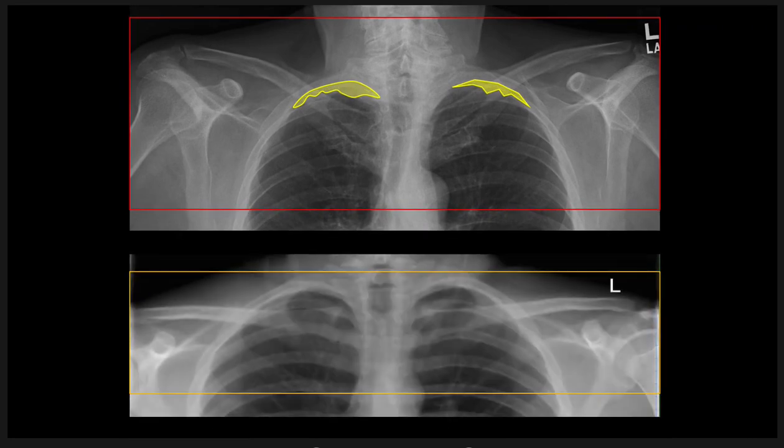Notice in the normal situation how we've got a really sharp appearance there at the apex. I can sort of look back and forth and see, yeah, there's just a little bit of irregularity there. This guy would be okay without, depending on your clinical suspicion, of course, but under normal circumstances, this is what the routine looking apical pleural thickening looks like. It's pretty symmetric, it's pretty thin.